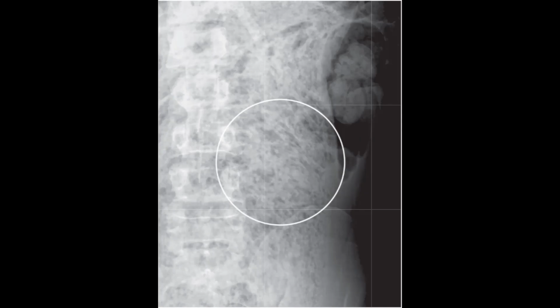As you understand, the air is not the main component of the large intestine. We have some stool, the feces, inside, and here you can see how they usually appear on images. Some soft tissue attenuation with micro air bubbles inside. We will see these contents inside of the ascending and descending colon. So now you're familiar with how it looks.